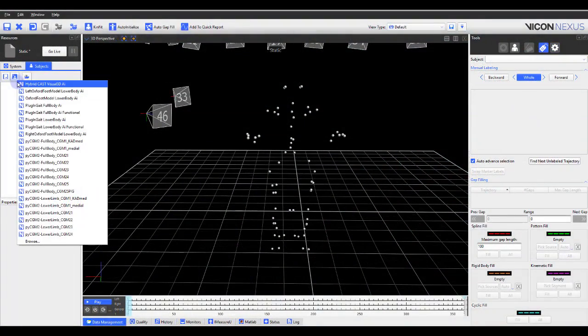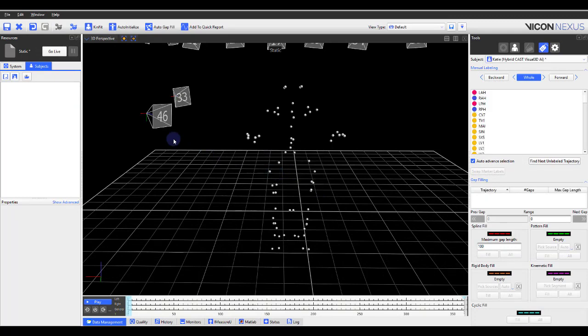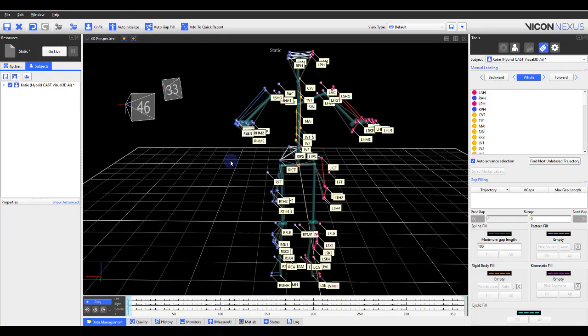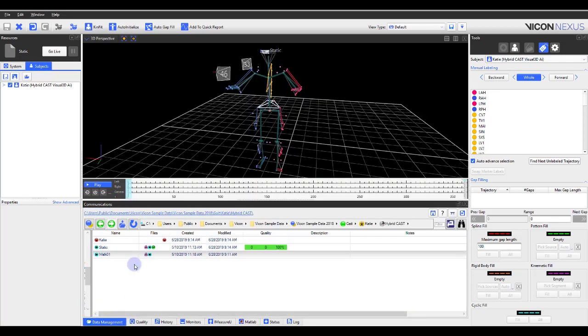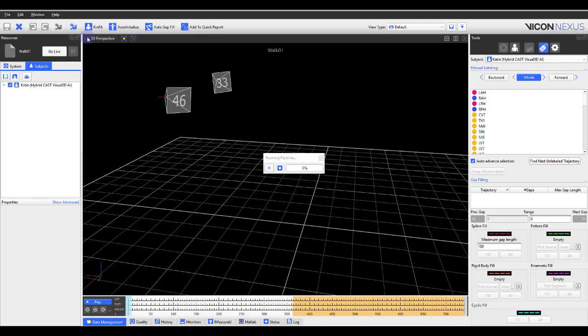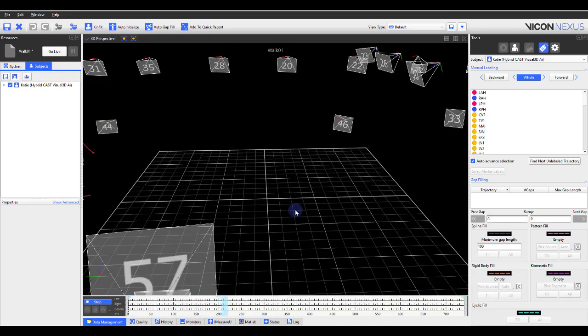If a user would like to use the hybrid cast visual 3D model within Nexus, you no longer need to generate your own labeling template, otherwise known as a VST. The hybrid cast visual 3D VST is now included within Nexus 2.9. So the marker set is automatically labeled when using the auto-initialize labeling pipeline.